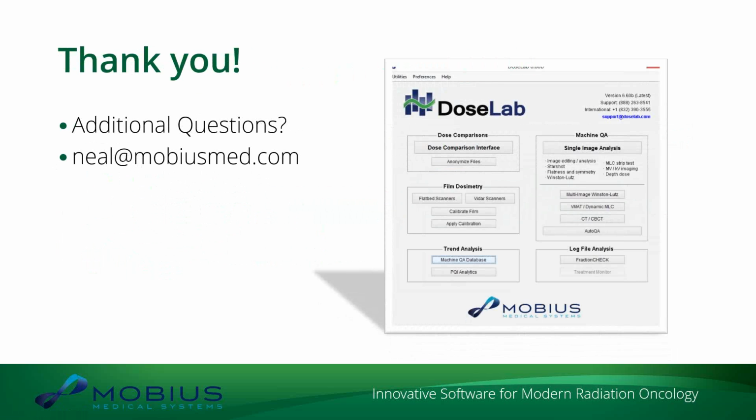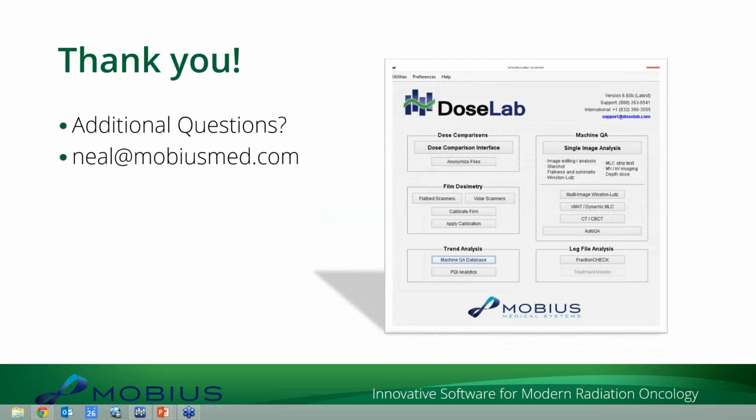Anything here for off-axis ratio in addition to flatness and symmetry? Not necessarily. We don't do an off-axis ratio test at the moment. I'm just trying to think if there's anything in the software that would allow you to do that.